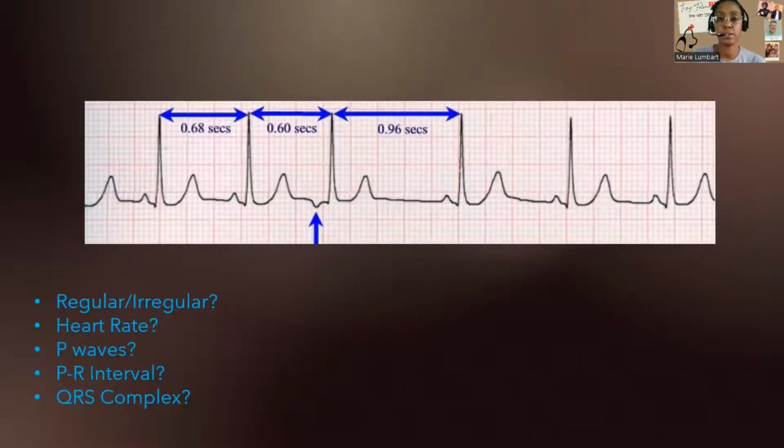So here's our next rhythm. Here's a reminder of the 5 steps. So pause this video if you need some more time to take a look at it. So is it regular? Based on the arrows, it's not regular. So let's look at the P waves.